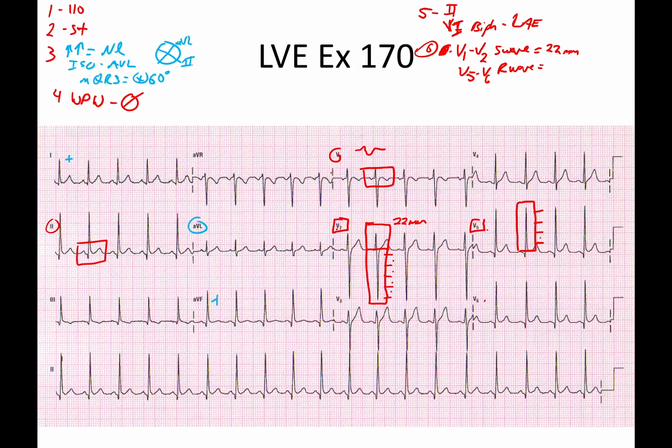We'll say 5, 10, 15, and we maybe got another 2, so 17, and we'll just say 3 more. So 17 plus 3 is going to be 20. Add those up, that's 42. That is well larger than the 35 millimeter goal that we wanted. It's much larger than that.